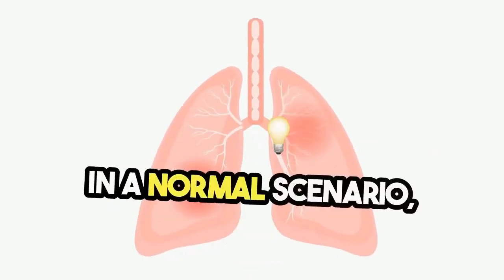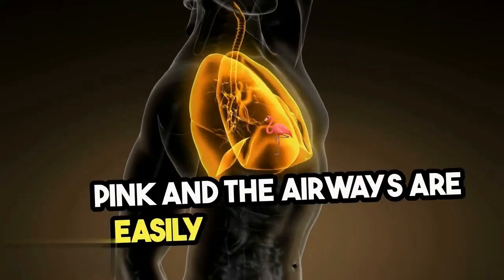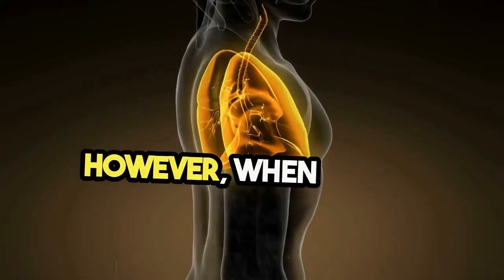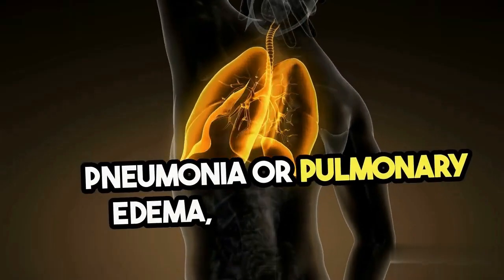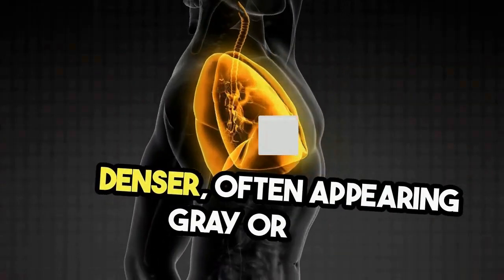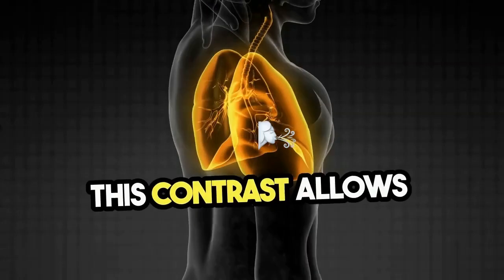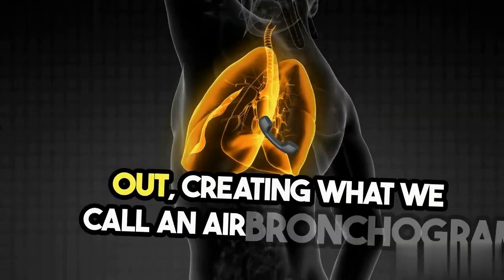In a normal scenario, the lung appears light pink, and the airways are easily distinguishable. However, when there's an underlying condition, such as pneumonia or pulmonary edema, the lung tissue becomes denser, often appearing gray or white. This contrast allows the air-filled bronchi to stand out, creating what we call an air bronchogram.